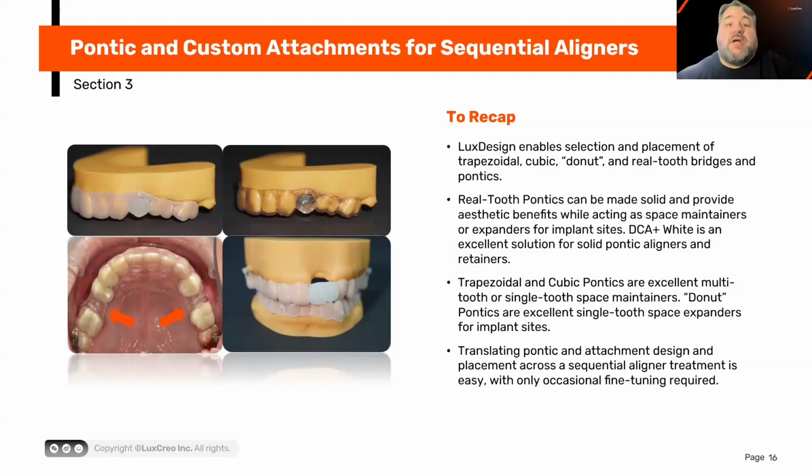They're great for preserving the space and can be used for single tooth expansion or implant sites. Being able to translate it across a treatment plan makes working with pontics and attachments that much easier. And if you haven't already, check out that DCA Plus white resin. It's a good solution for solid pontics. Like in this example, it looks great and preserves the space in that lower right-hand corner image.